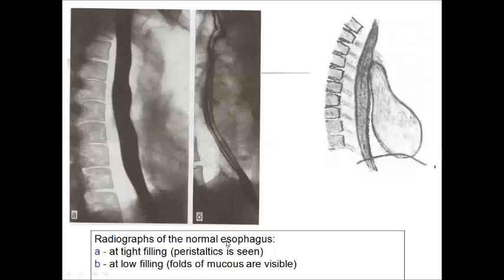Another picture showing us X-ray of a normal esophagus at tight filling. In this phase, peristaltic waves may be seen and evaluated, their speed and their completion, and a picture of the contrasted esophagus at low filling when small folds of mucosa are visible.